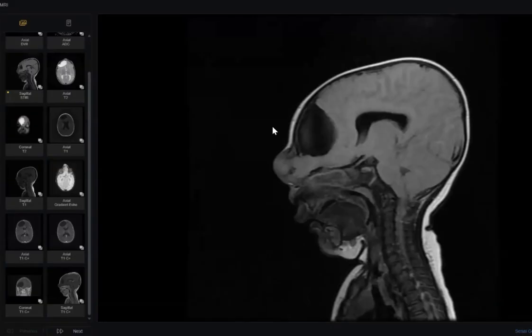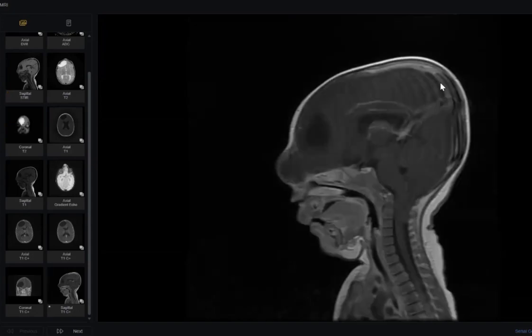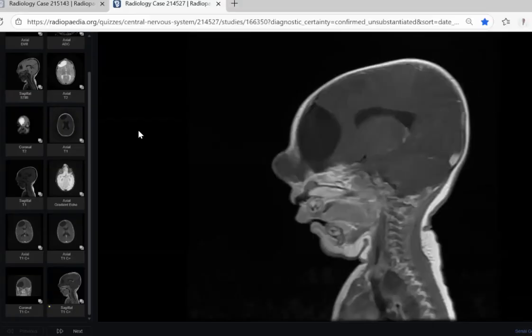This sinus. What is the name of this? Sir, sorry, I couldn't see your pointer. This sinus. This one. Falcine sinus, or this falcine. Yeah, falcine sign. Minor, but it was just a case of satisfaction of search. Thank you, doctor, so much.